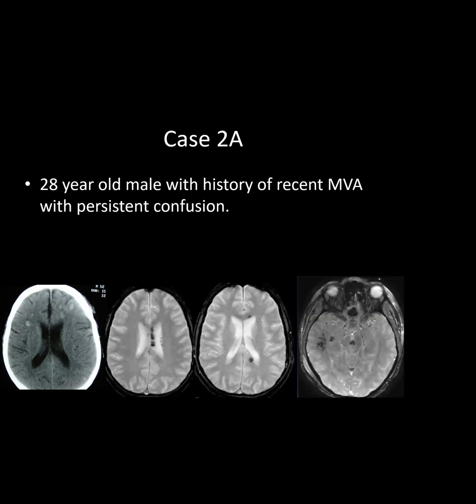If you look at this case over here, just to go quickly through this. Dr. Zhang, just take this case too, for speed purposes. So there's a head CT and some GRE images over here. What is GRE good for, Dr. Zhang? GRE basically looks at the bleeding, like hemosiderin. Yeah, it's good for blood and for calcium. Blood and calcium are going to be dark on there. What's a better sequence than GRE for looking for blood or calcium?